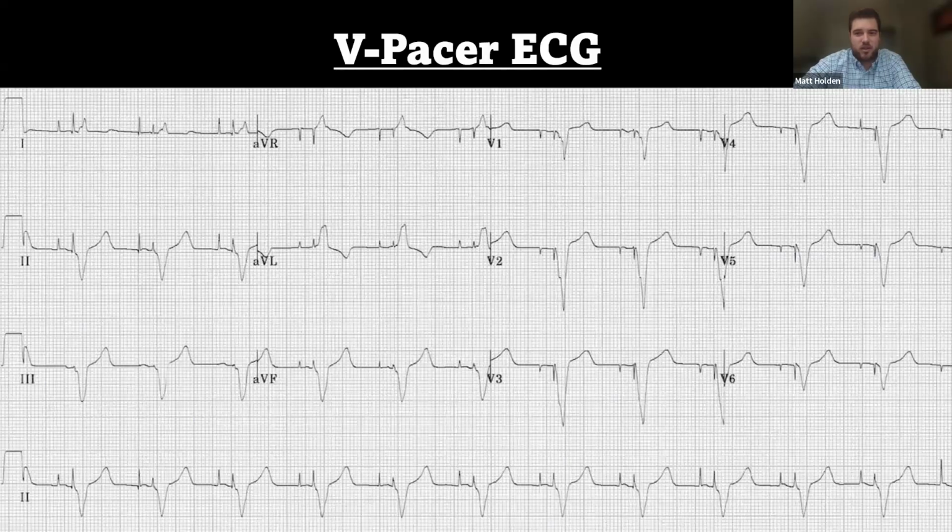Now your V pacer things, you're going to also notice this. You're going to have these little spikes here before the QRS, and you can also see them right before the P wave as well. This is going to be your AV pacer. So one's firing off a P wave and one fires off a QRS for the ventricles. So with these, you're going to have usually, because nothing is really ever an absolute, if it's wide, it's usually going to give you kind of a left bundle branch block morphology. You can see here my QRS is up, my T wave is down, and if my QRS is down, I'm usually going to have a little ST elevation.